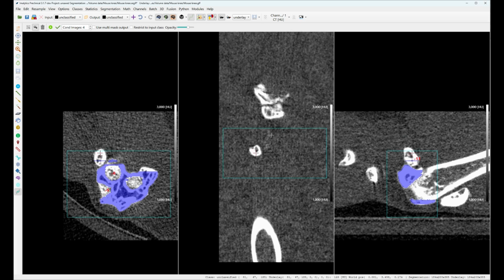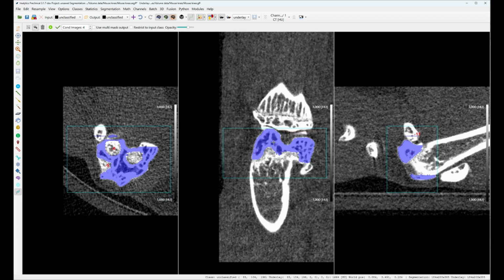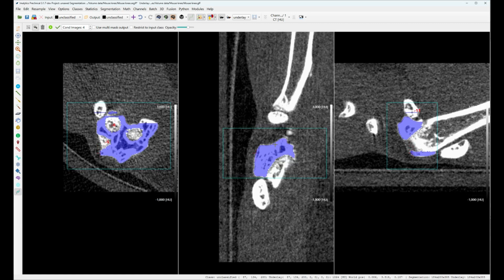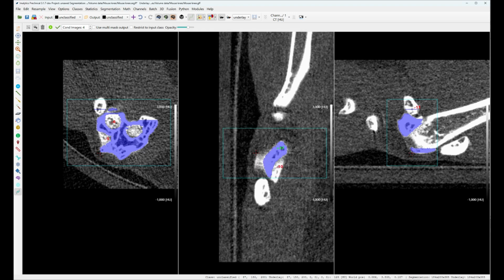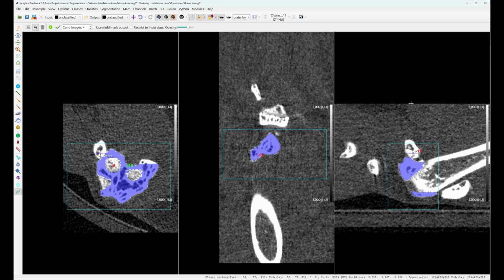Please ensure that the slices that have been annotated are as good as possible, as these slices will not be re-inferenced upon during propagation. Of course, you can still correct them by adding prompts. So let's correct a few slices and run the propagation again. You can repeat this process as many times as necessary.